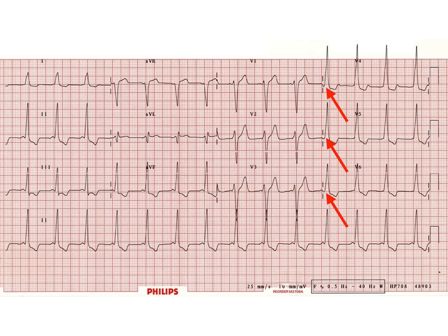If you see the answer procainamide, that's the answer. But Wolff-Parkinson-White syndrome, very, very high yield. Be able to recognize this upslanting. And again, I'm just really going to hone in on this. You don't have to dissect this ECG and go, rate, what's the rate? Rhythm, what's the rhythm? Axis, what's the axis? You see the delta wave, the answer is WPW.